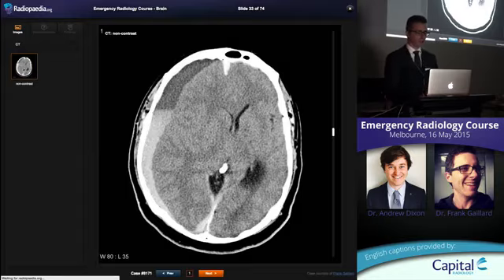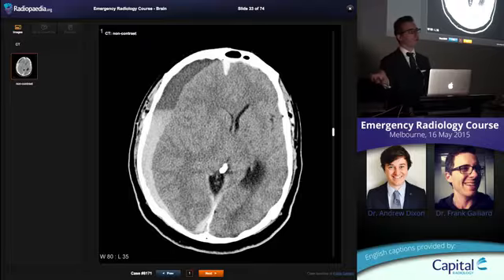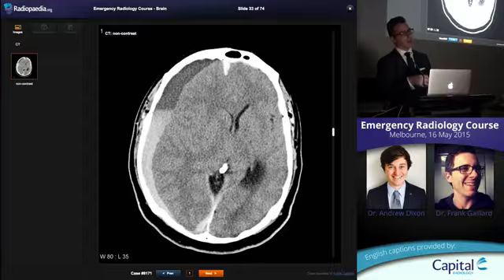This is more of what you would see in an acute on chronic subdural. So this patient, usually elderly, they will have bumped their head months and months ago, had a small unknown subdural, and like all blood initially starts off as hyperdense and then gradually becomes less and less dense until it's almost CSF intensity. And then they bump their head again and they get a fresh bleed in it.